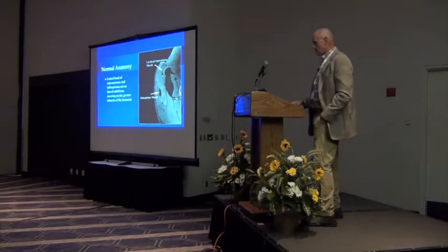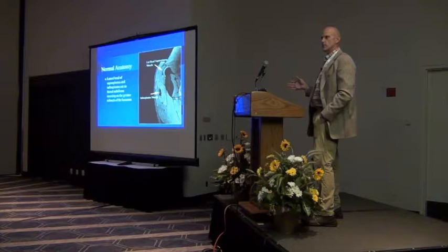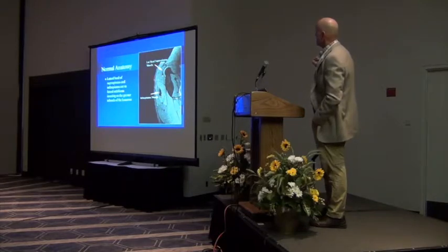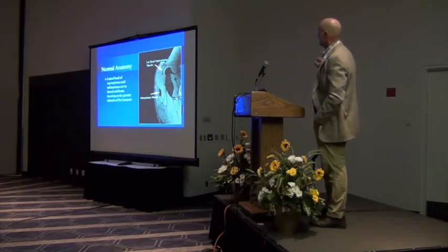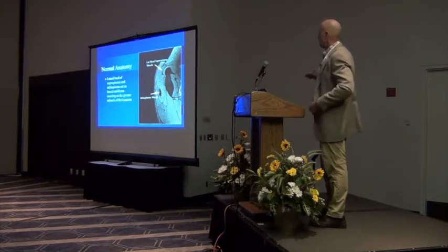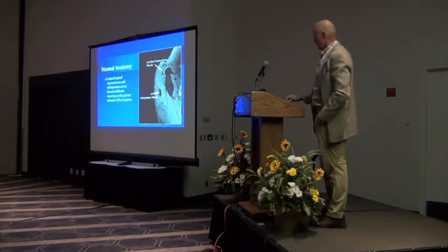Now, I had the luxury, and for those of y'all that don't really recognize this, if I have an MRI of a horse's shoulder, it's probably not a good thing for the horse, right? But it's pretty unique in that you can see the anatomy fairly clearly. And there's that supraspinatus that I was telling you about. Look at there's the supraglenoid tubercle, and you're already seeing it divide into two bundles. And then there's the infraspinatus, and I'll show you another slide that emphasizes a little bit.